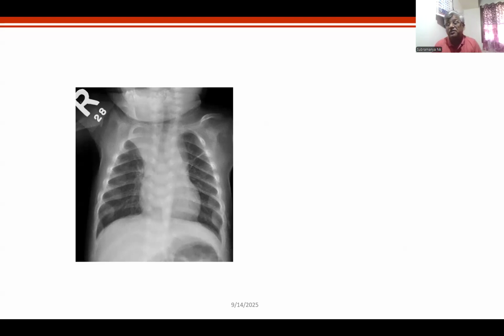That means between two pediatricians, there is a confusion between thymus and collapse, that makes me worried. Did you understand my point? That's fine, but it makes me worried. I'll tell you how to differentiate a thymus from a collapse later on. Okay, collapse, pneumonia, thymus, three confusions. No problem. Everything fine. I agree with all of you.